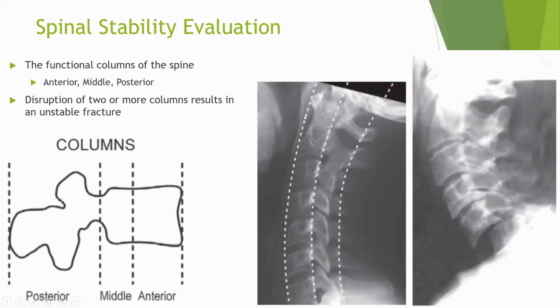All right. Now, what are these dots? These dots are basically your spinolaminar line, your George's line, and your anterior vertebral body line. This is your anterior vertebral body line. All these dots or lines are symmetrical. They need to be as smooth as possible, like this. Then you know your patient has intact spinal curvature, intact bone, intact disc, intact height of vertebral body, and possibly intact neural foraminal diameter.